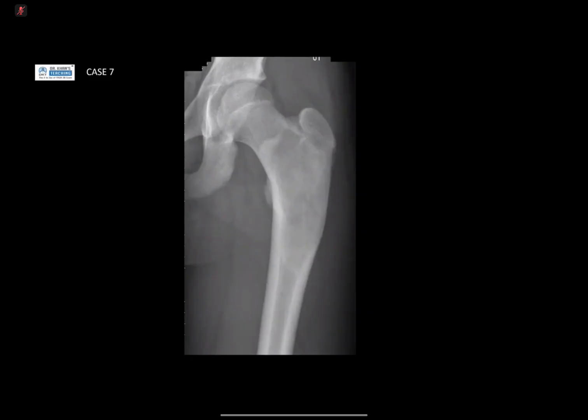Okay, excellent. So yeah, this is a nice example of fibrous dysplasia. They can be mildly expansile, and you get that nice ground glass, smudged appearance internally, which is that fibrous matrix that tends to be poorly organized.